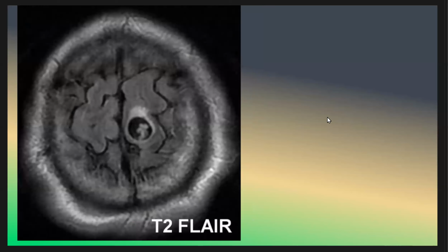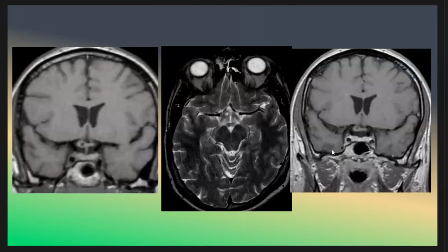What do you think the patient has? This is T2 FLAIR, and what do you think? This is neurocysticercosis, and this is the vesicular stage. We have 4 stages of neurocysticercosis. We should know the stages of neurocysticercosis. Okay, we move to the next case.